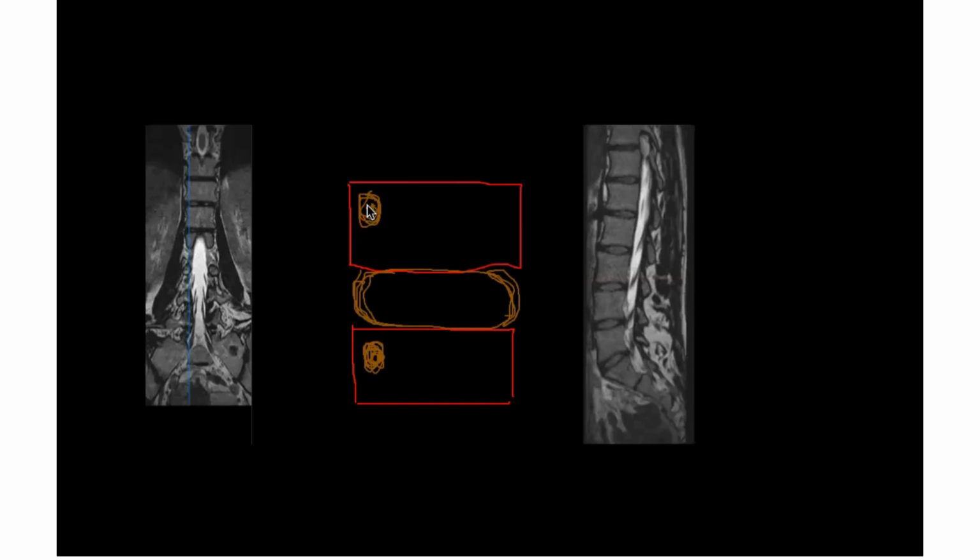So this is a pedicle over here. Initially all the nerve roots are in the center, in the thecal sac. As this nerve goes towards the disc, it will enter into this groove here, and it will go like this.